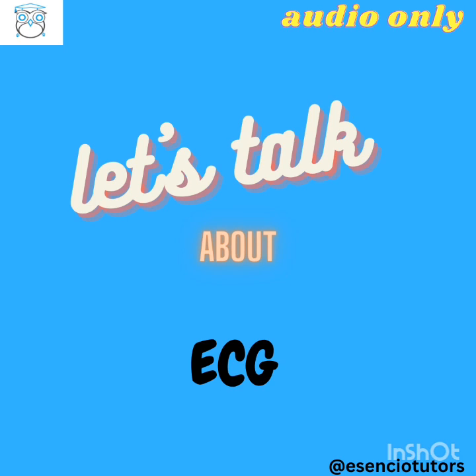So good job there with the approach. All right, let's see another one here. All right, Entasha, try this.